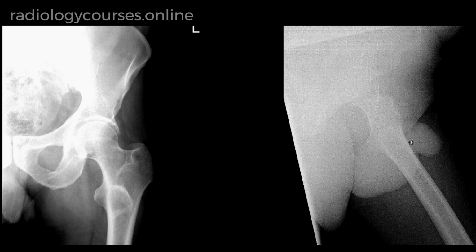So, based on these appearances, and since the patient is asymptomatic in this region, features are most likely to represent an incidental benign bone lesion. As the lesion is predominantly lucent with sclerotic rim, features are most likely to represent a non-ossifying fibroma.